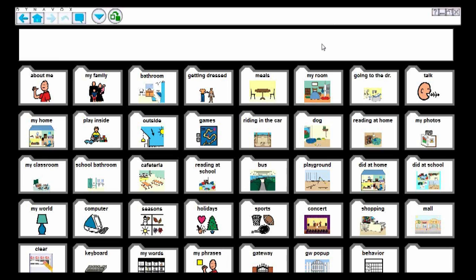And there you can see as an individual increases in the vocabulary that they have and the way that they're putting words together, you actually have more buttons available to you. Your other option, of course, is to actually individualize it and create your own page sets, so you can do that also, and we'll cover that in a moment.